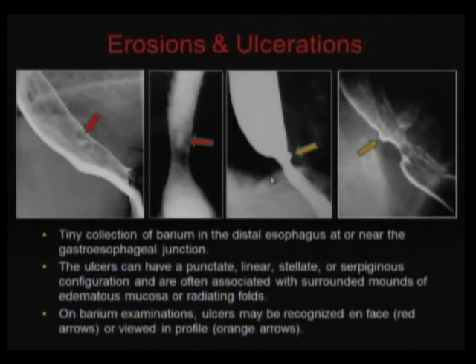This is different than other ulcerations or erosions. For example, if you have infectious esophagitis, in some cases you can see the ulceration, but it's surrounded by normal mucosa. In this case, it's almost always surrounded by granular mucosal pattern or strictures, hiatal hernia, and you can see the reflux. You cannot get esophageal ulceration without a significant reflux when you perform the exam.